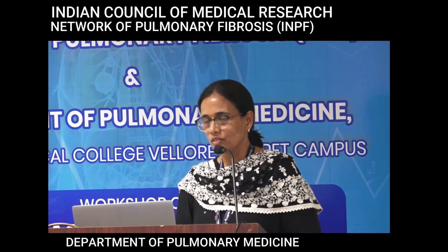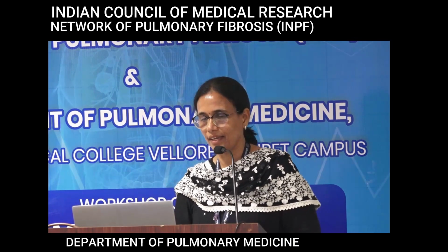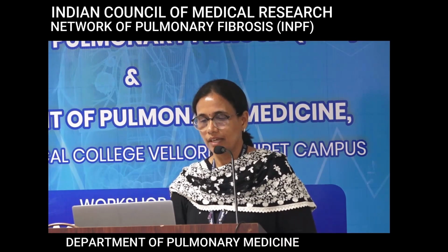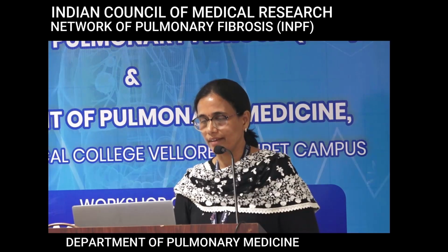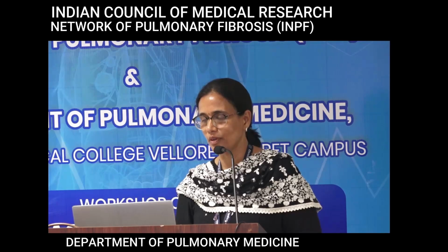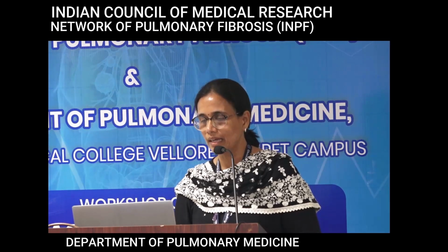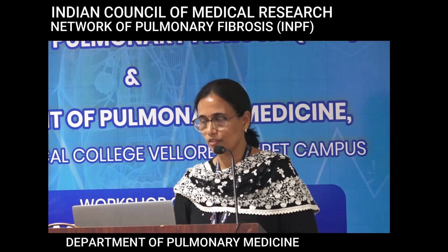So this was a CTD or scleroderma patient who is having a UIP pattern. So then it is a CTD ILD with a UIP pattern. There are some signs which have been described for CTD ILD, which is exuberant honeycombing, excessive honeycombing. The straight edge sign, that is in the lower lobes, the differentiation between the area of fibrosis and normal lung on the coronals looks like a straight edge. That is also supposed to be one sign of CTD ILD.